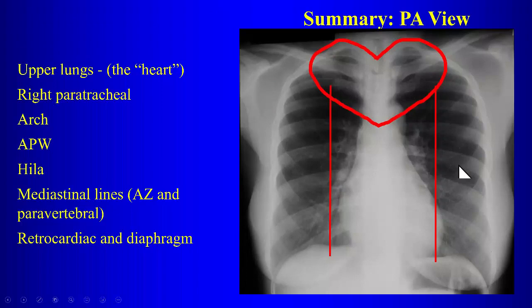So what I like to do is to superimpose a pattern like this on a chest radiograph. These are the areas that you want to look at very carefully. So here's a nice little heart here over the upper part of the chest. So this area here, especially in the apices, you want to look at very carefully. Here close to the midline, the mediastinum overlying the hilum. Lesions can easily hide behind the heart, so these areas too you have to look at carefully. Usually lesions that are out here that are surrounded by lung parenchyma are easily spotted, so those tend not to be lesions that you're going to overlook. These are the areas that you have to pay careful attention to.